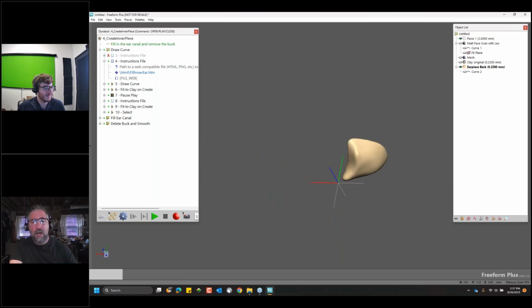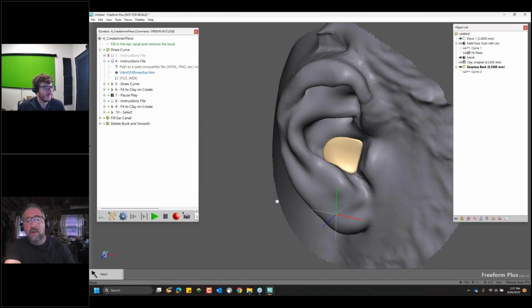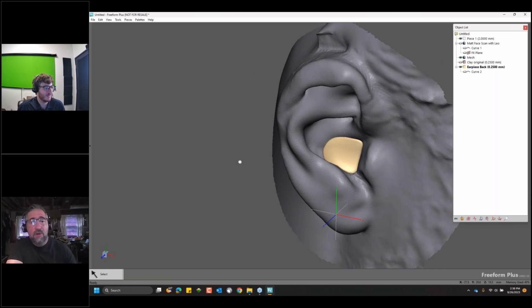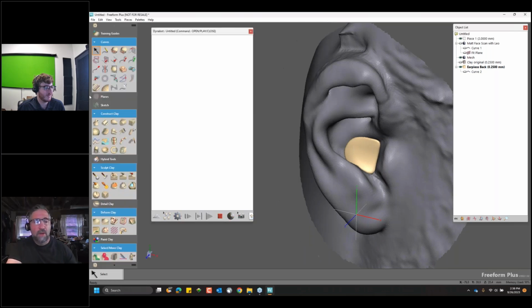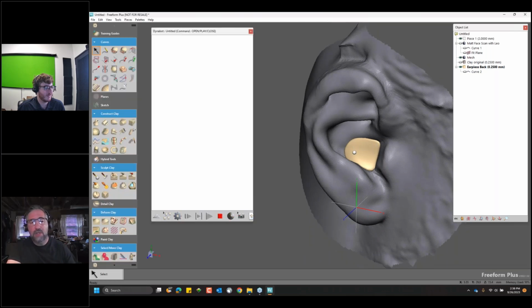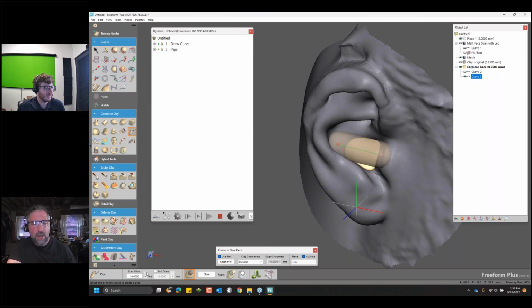So all of that, I had to click only a small handful of times and follow some steps, and I got the same type of part. And from here, to show you how easy this is, if I create a brand new script, start recording, I can open up my tool palette, and from here, if I wanted to build something in front of this model, like using a 3D curve, I want to create a pipe that I'm going to combine into that piece.